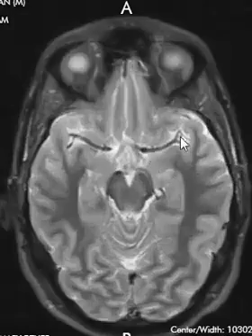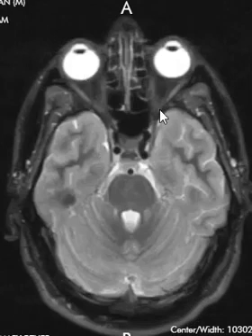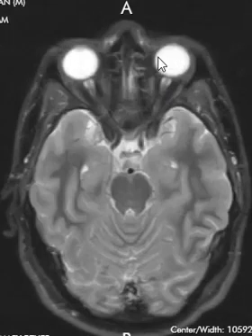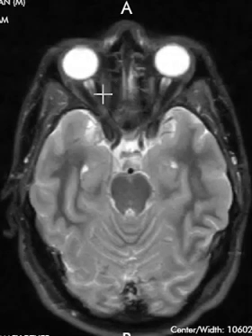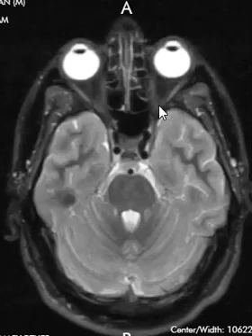You can see these blood vessels here, left middle cerebral artery, right middle cerebral artery, and the eyeballs again here. On this sequence as well, the fat is really dark. So you can see fat around the edge is dark, and also fat within the orbits is very dark as well. So if there were an inflammatory condition involved in the eyes, that would stand out. And we can see these optic nerves here again coming off the back.